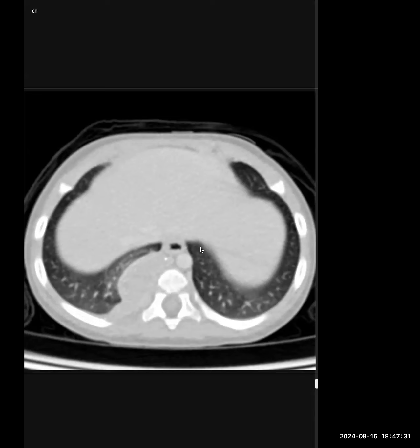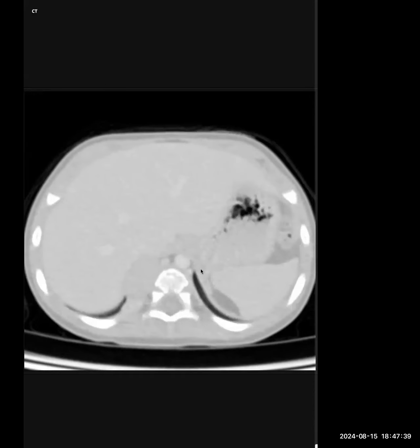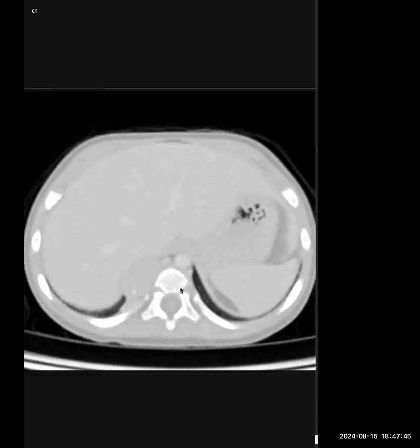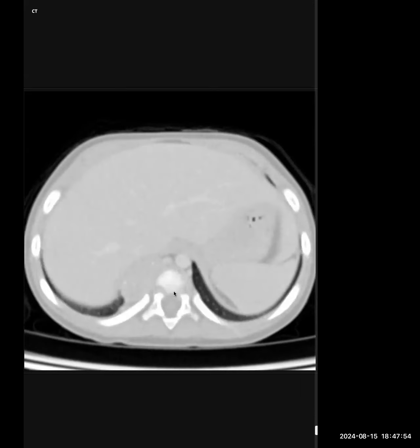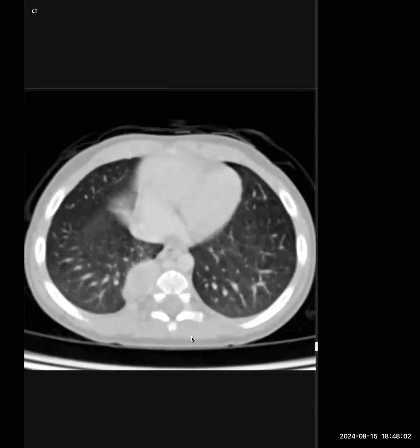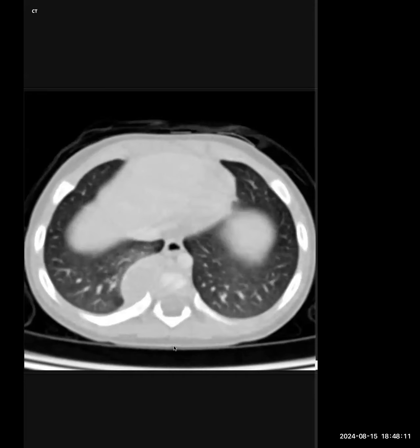It is abutting the vertebral bodies causing focal erosions, and it is also extending along the pleural surface. There is also some erosion of the adjoining ribs. The lesion is also extending into the posterior mediastinum and extending extrapleurally into the hemithorax with atelectatic changes surrounding it. There's no fat density within. And there is some neuroforaminal extension along a few of the vertebrae.